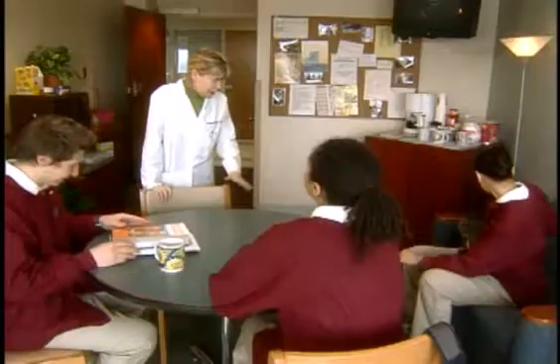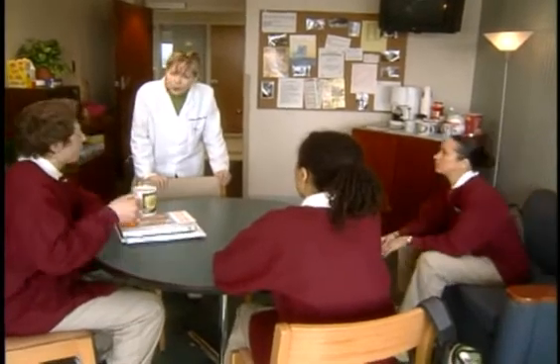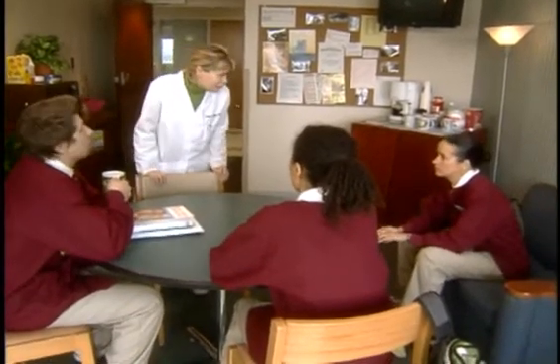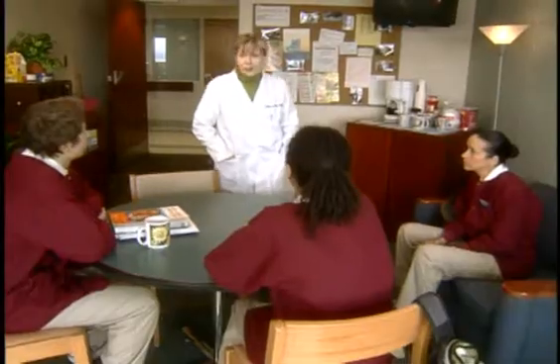Morning, everyone. Morning. Okay, today I'd like to talk about issues relating to oxygenation. Can anyone tell me what a pulse oximeter is? A pulse oximeter is a device that determines the amount of oxygen saturation of arterial blood. Good. When could it be used? Well, a physician might order a frequency or parameters for checking a patient's oxygen saturation. Good. Any other time?